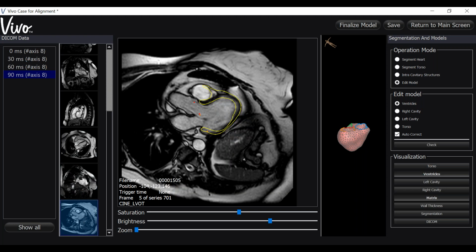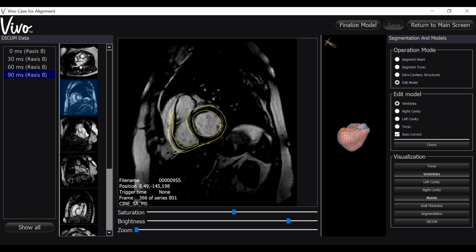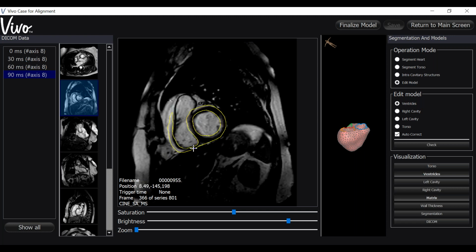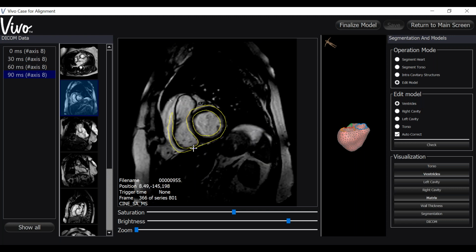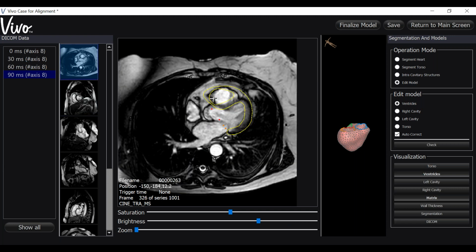And bring that in a little bit. And I'm going to save again. Okay. So we're looking pretty good here.